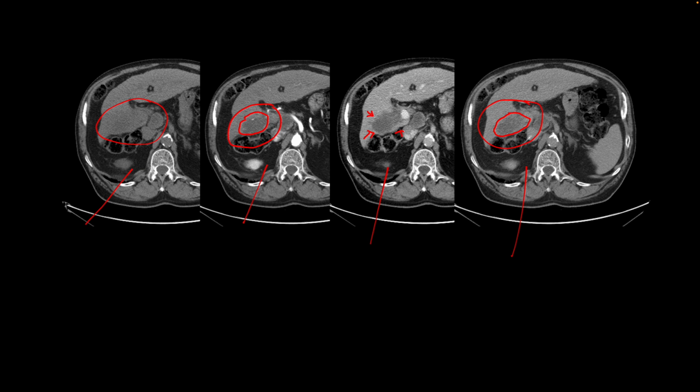Similar to hemangiomas, although hemangiomas would show nodular enhancement, which is discontinuous, and more intense enhancement on the arterial phase, and they will also fill in slowly, as opposed to a hepatocellular carcinoma where there will be uniform arterial phase enhancement, and on the delayed images we see washout and formation of a pseudocapsule. So this is a classic cholangiocarcinoma with metastatic disease to the liver hilum in a lymph node in a cirrhotic liver.